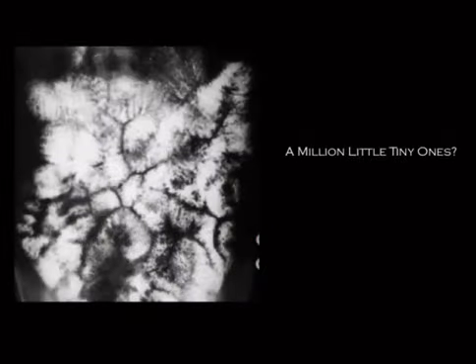What if you've got like a million little tiny ones? There's really only one thing that does this, and it's lymphoid hyperplasia. Again, it's one of these small bowel zebras, but the history is testable and it's classic. It's a person with severe diarrhea who has an immunodeficiency, like a common variable immunodeficiency or absent IgA. Otherwise, it's not well understood, but that's all you would ever need to know about it. Innumerable filling defects in the small bowel, history of diarrhea, absent IgA.